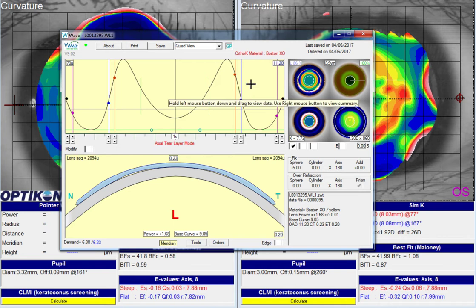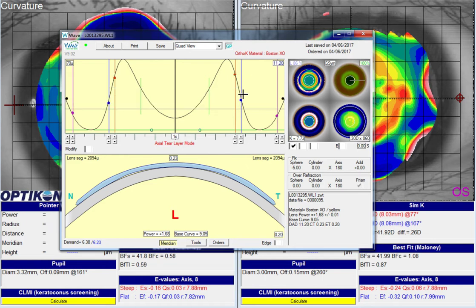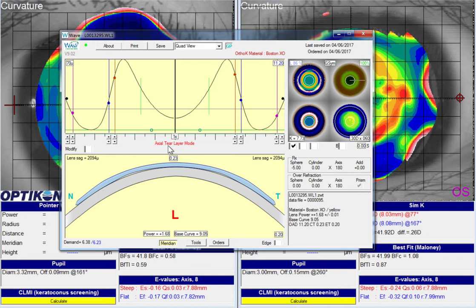So the first thing we'll do is right click and measure where we're starting from. We're at 717 microns at the blue dot and 1816 at the pink. So I'm just going to write those down real quick. For this case, I would aim for between 15 and 20 microns of change. So if we pick 17 as a midpoint, then from 717, we want to end up at about 734.